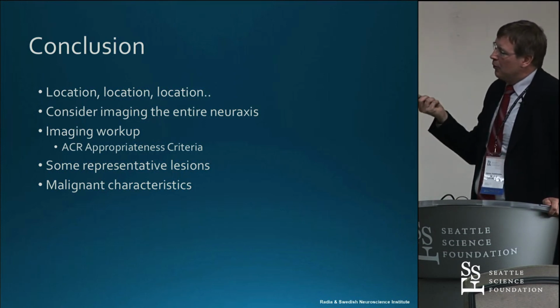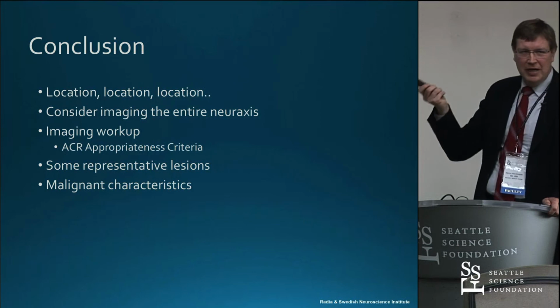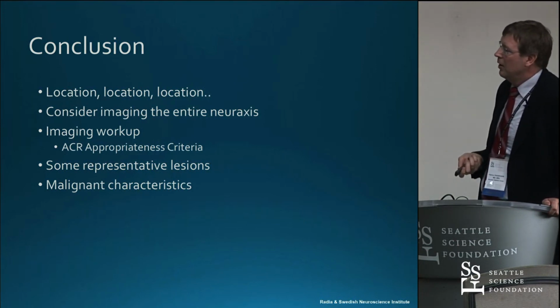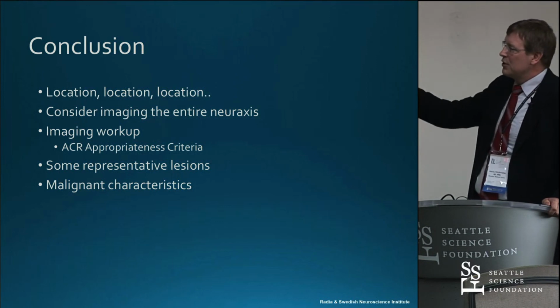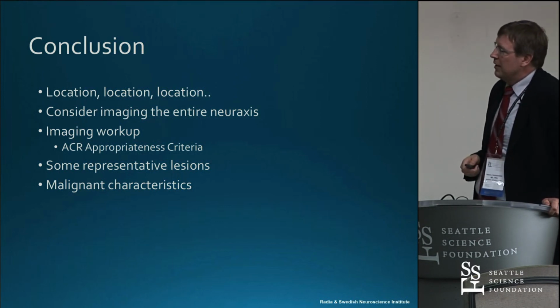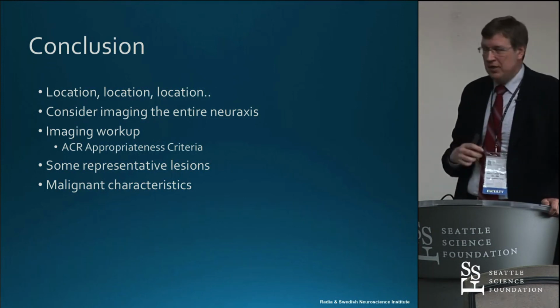I walked you through some of the imaging workup for different conditions and introduced you to this concept of ACR appropriateness criteria, which I definitely recommend you take a look at. It gives you an idea what studies to order for different conditions. We went over some representative lesions and talked about the malignant characteristics of tumors.